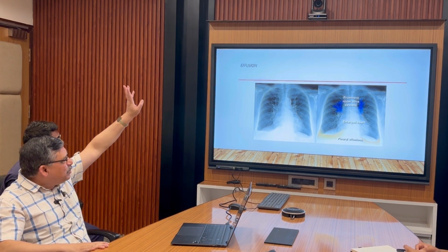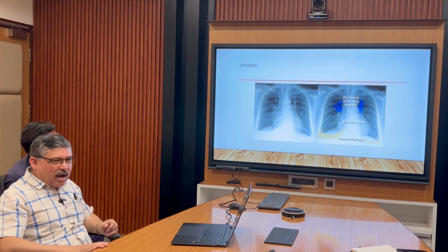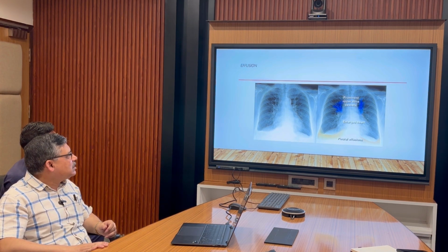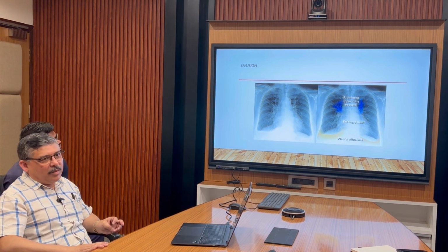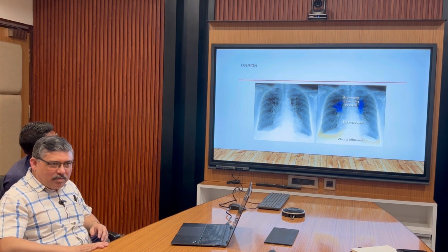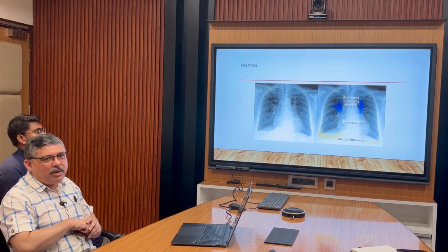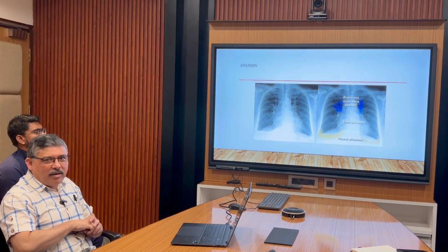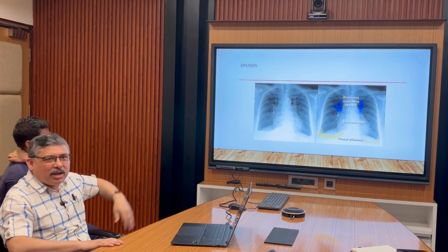If the blood vessels are visible in the upper part of the lung, then you know there is congestion of the pulmonary vascular system. Okay. So there is congestion of the pulmonary vascular system, there is a cardiomegaly, and there is bilateral pleural effusion. This is a heart failure. No? So if you are given a X-ray like this, you will be describing everything about it.